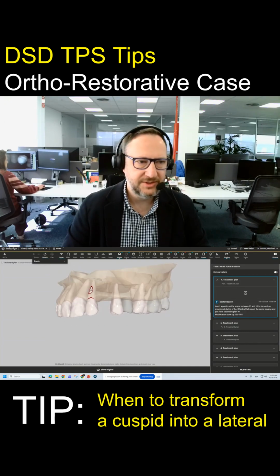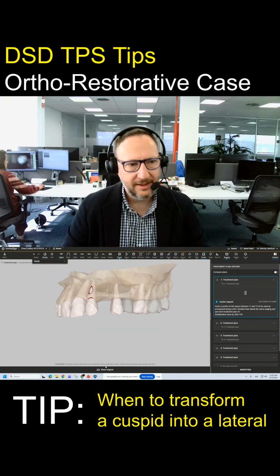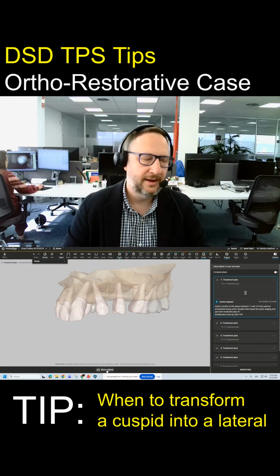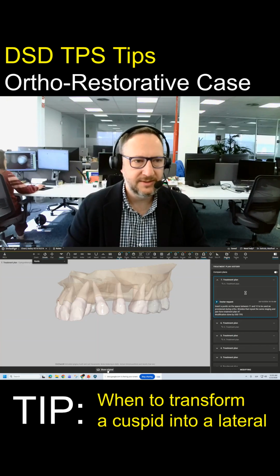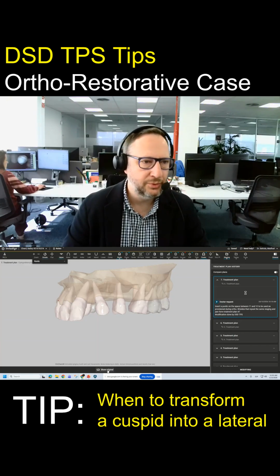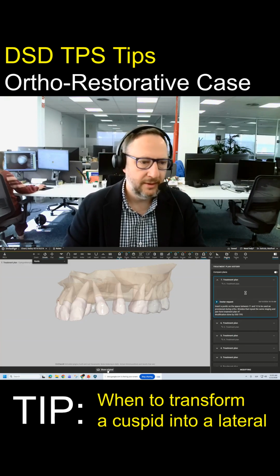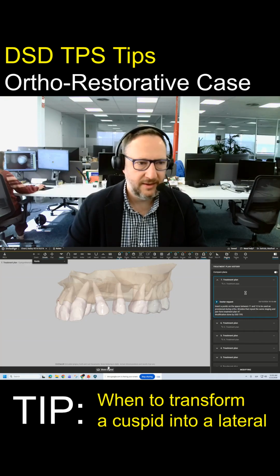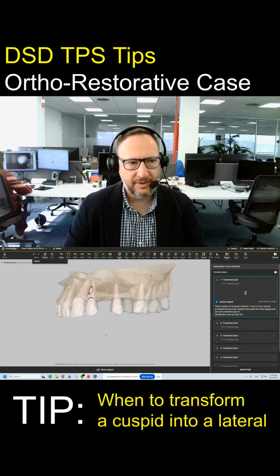Here, just a quick note. You are seeing the root moving a little bit out of the bone, okay? But considering where the root was originally, and considering the patient is very young, what we expect is that the bone that we see around the root will remodel together with this movement. And mostly because the root movement is much smaller now, we don't expect that this is going to actually happen, because bone regeneration and bone remodeling will be happening around.